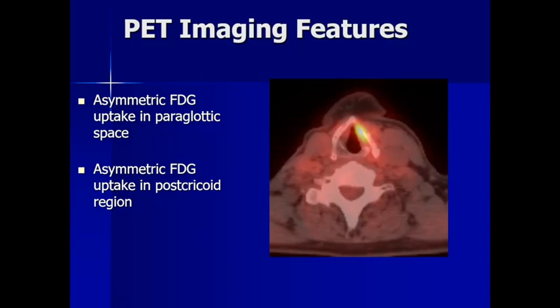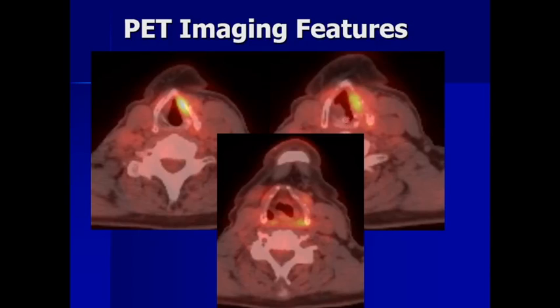I wanted to show you this really nice case that we often see. This is a patient that had lung cancer and they got their post-treatment PET scan well 3 months beyond their treatment. And this was read at an outside institution as a left true vocal cord tumor. This happens a lot. But I want you to look at the opposite side. Notice that the cord on the right is midline, has no FDG activity. You have a laryngeal ventricle that is dilated, as is the piriform sinus. And what we're seeing here is the problem is the right side. We have a right true vocal cord paralysis, and we're seeing normal FDG activity in a normal left true vocal cord.